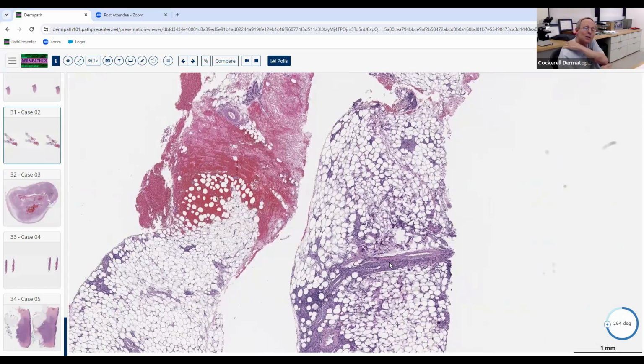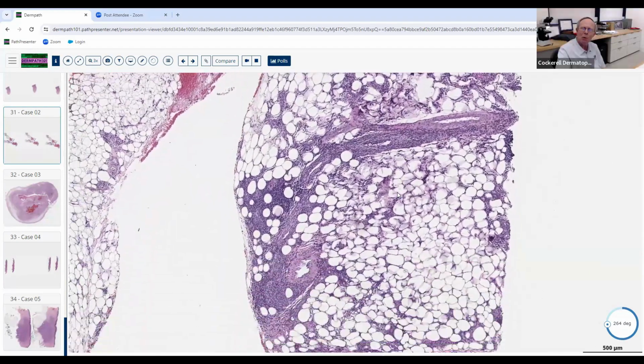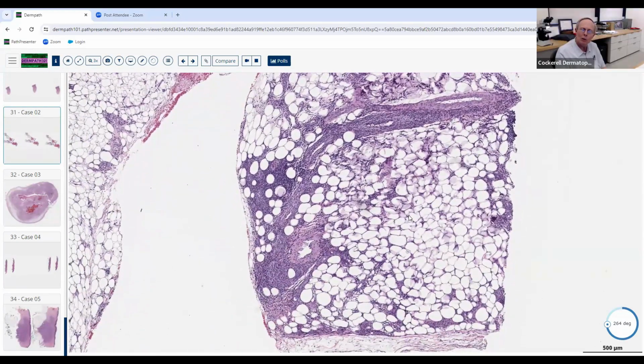With a lot of necrosis and degeneration of the lobular fat. Is that like pancreatic? No, that's more degeneration of fat with secondary neutrophilic infiltrate. So not really vasculitis there. But if it had vasculitis and it had lots of lobular involvement with degeneration of the fat in the lobules, what's that diagnosis? I'm not sure about that.